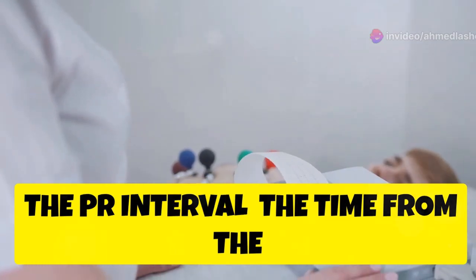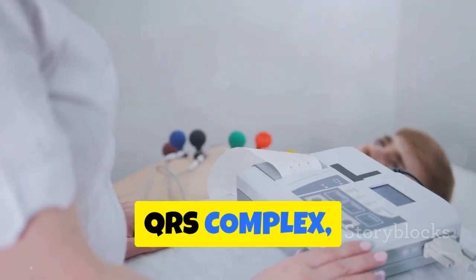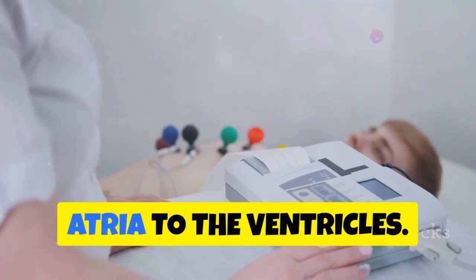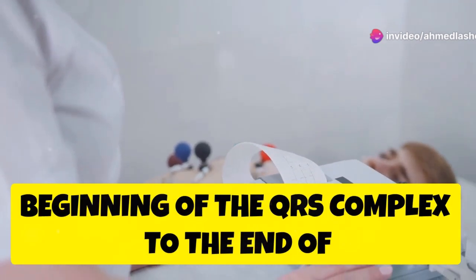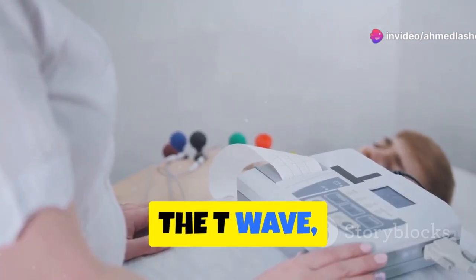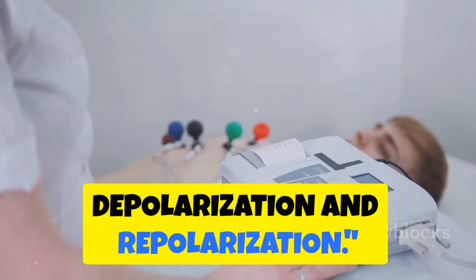The PR interval, the time from the onset of the P wave to the start of the QRS complex, reflecting the impulse travel from the atria to the ventricles. The QT interval, the time from the beginning of the QRS complex to the end of the T wave, showing the total duration of ventricular depolarization and repolarization.